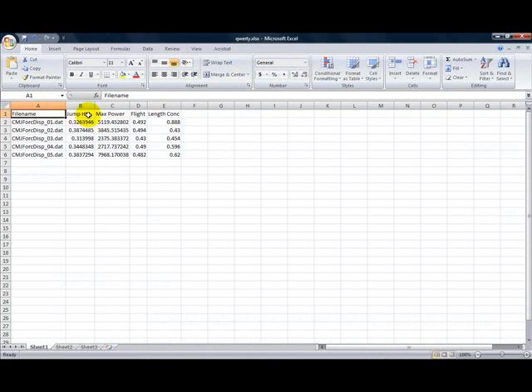Here it has output the 4 variables that we selected in the Variables Options panel. Jump height in meters, maximum power in watts, flight time in seconds, and the length of the concentric phase in seconds.